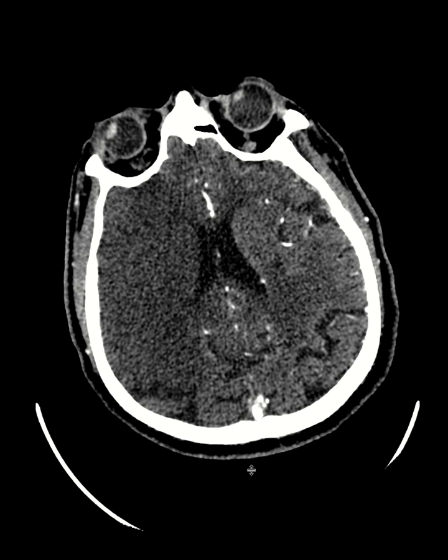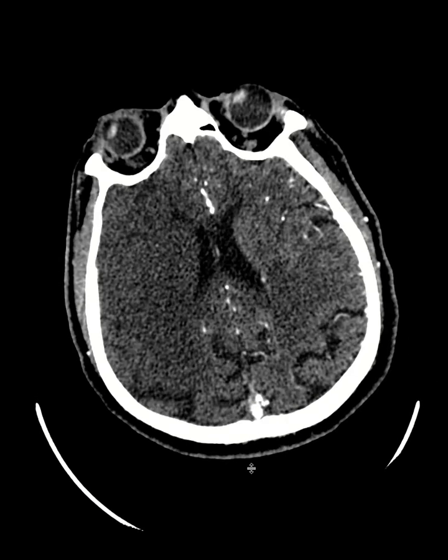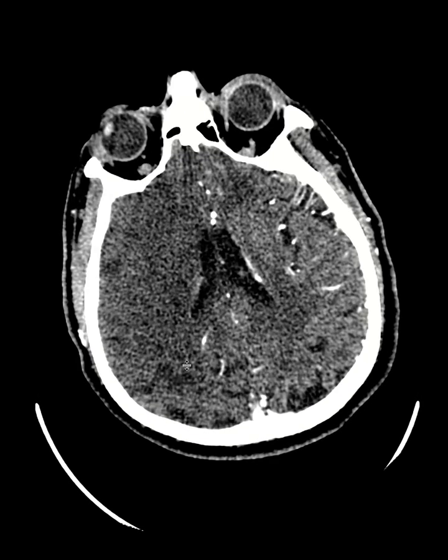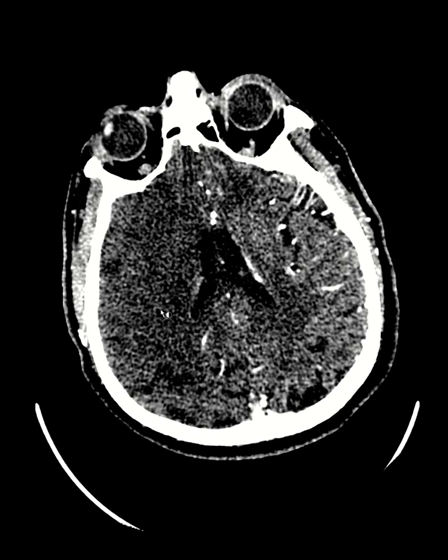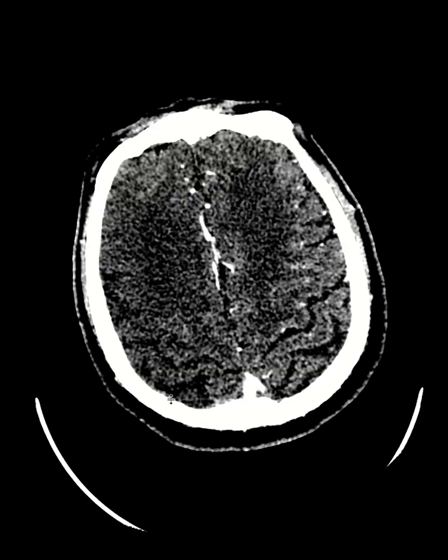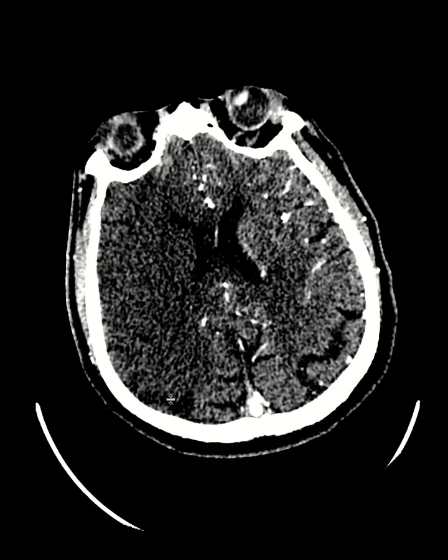So when you're reading these CTs, first of all you need to say, okay, there is a CT perfusion which is positive, there is a vessel involvement which is basically right MCA complete occlusion, and then if you look at the CTA part with contrast or even without contrast, you're going to see some loss of gray white matter differentiation. It is a little bit difficult to see on this one, but if you look closely, the gray white matter junction in the right cerebral hemisphere is a little bit disturbed compared to the left side. You see more gray white matter differentiation on the left, but on the right side you don't see it that well. So that's the early sign of a stroke on CT, that you lose your gray white matter differentiation.